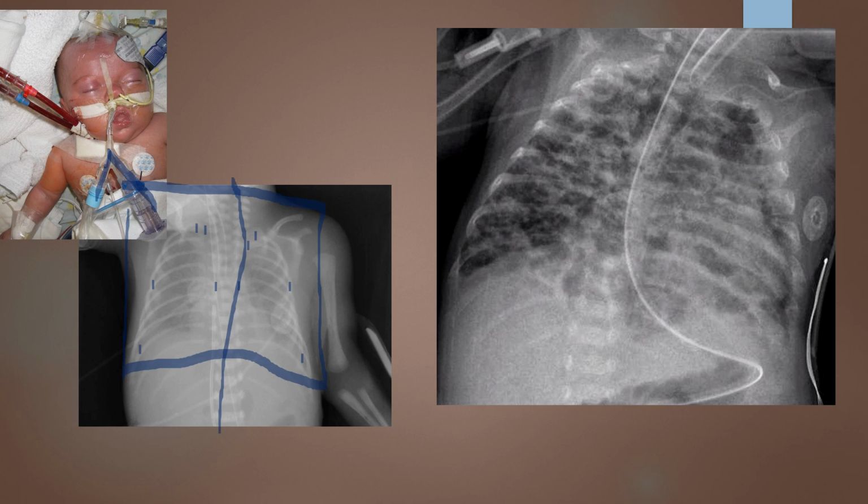Here you see another baby that's obviously in respiratory distress. This patchiness would indicate that they are having some significant lung issues. You can tell right off the bat, anatomy is there. We've got apex to angle, angle to apex. I see right off the bat that we have some quantum mottle. So as I evaluate the technique, I'm going to say my soft tissue detail and bony trabecular pattern are not there. So technique-wise alone, this would likely need to be repeated. So I want to see what other improvements I can make as I repeat this.